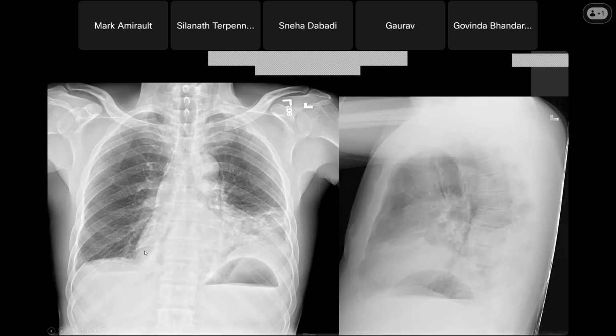And then after that, I kind of go outside in. So then I'll look at the bones, even though that's not really a concern. As a radiologist, we look at everything. So I'll look at the ribs, scapula, shoulder, clavicle. Same thing on the other side. Look at the ribs, look at the spine quickly.